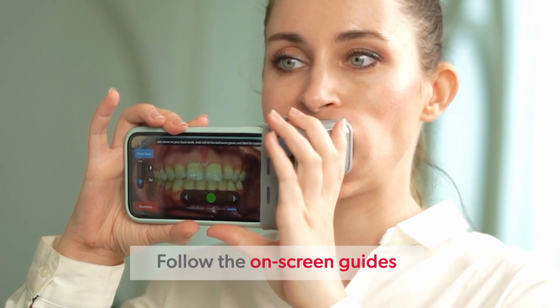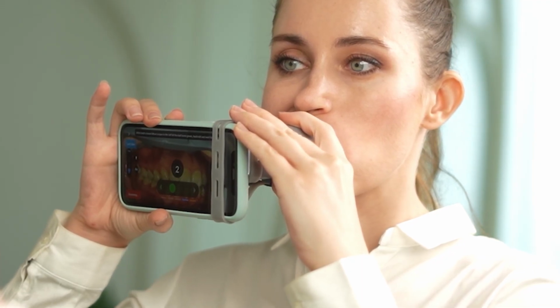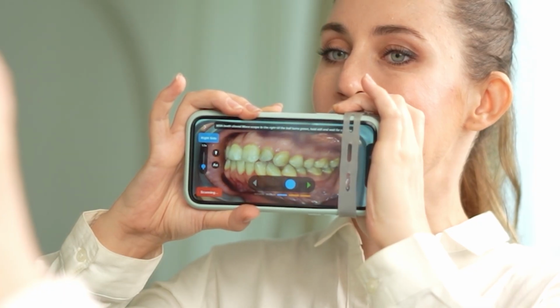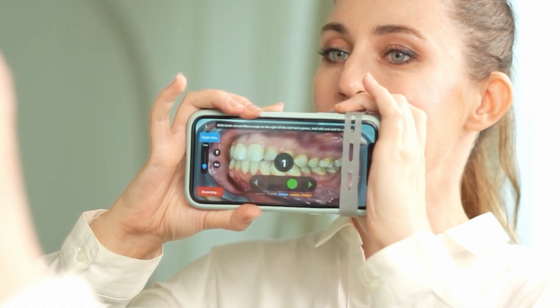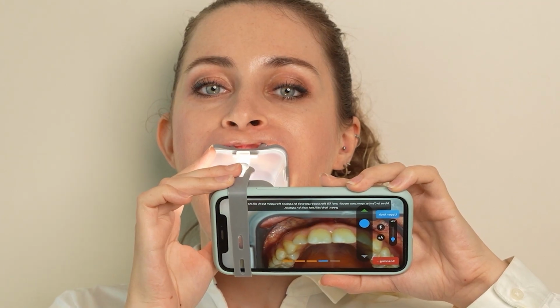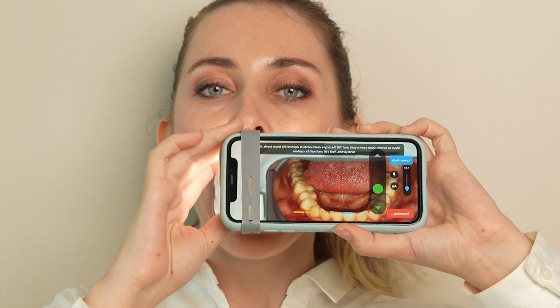Follow the on-screen arrows. For the left view, turn your head to the right to capture the left side. For the right view, turn your head to the left to capture the right side of your teeth. For the upper arch, open your mouth slightly and tilt up. For the lower arch, open your mouth slightly and tilt down.